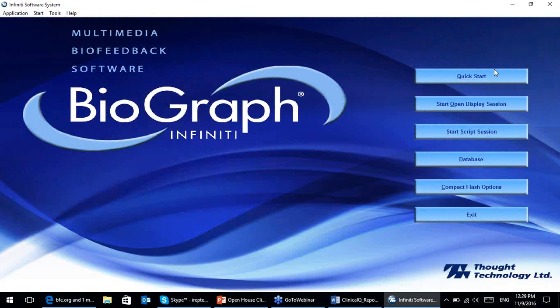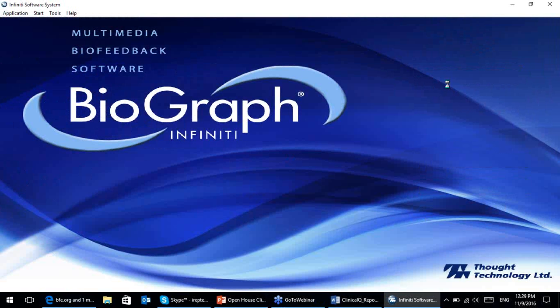This is generally how I have people initiate any type of ClinicalQ assessment session or harmonic testing session, because it's just the quickest, fastest way to do that.